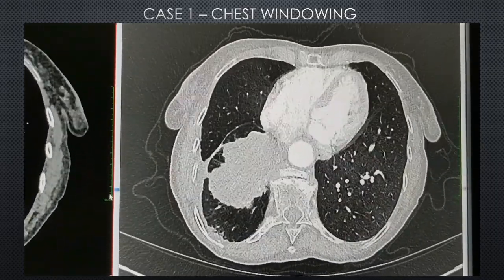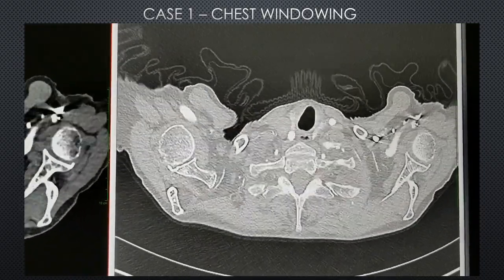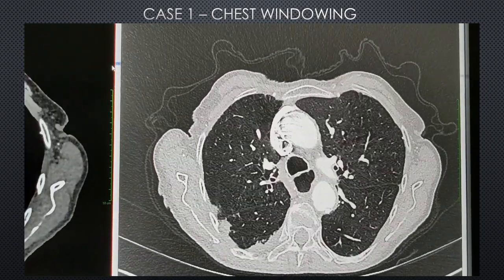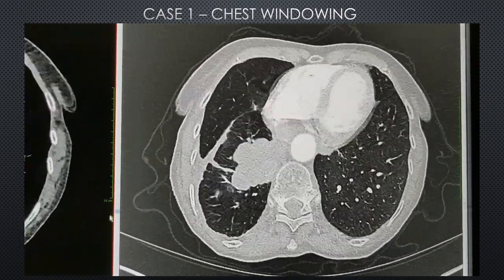And there's one other thing that we can see on here, which I'll try and get a bit clearer. So like I said, this is looking from the top down. You've got in here your trachea and esophagus, and if you keep a close eye on the esophagus itself, you'll see as we go down and the lesion begins, you see how narrow this esophagus becomes, and so there's mid-esophageal narrowing because of this, and that can cause a whole host of symptoms and problems for the patient, to the point where they may get NG tube or PEG fed if it becomes severe enough.